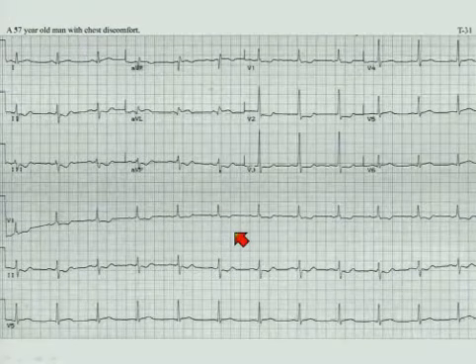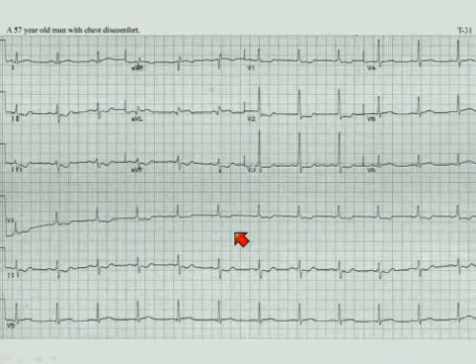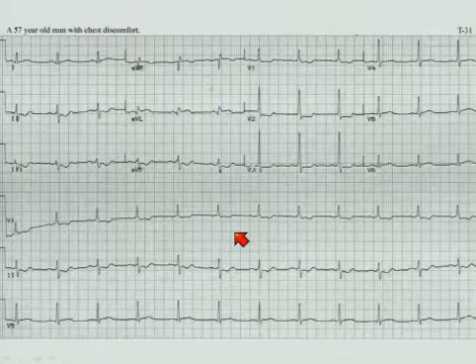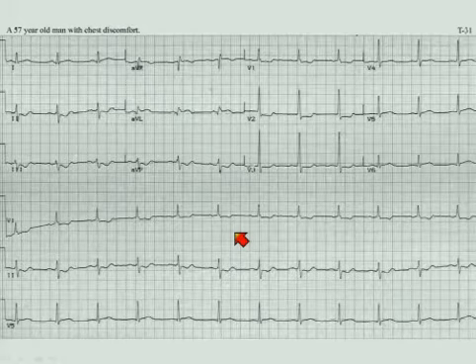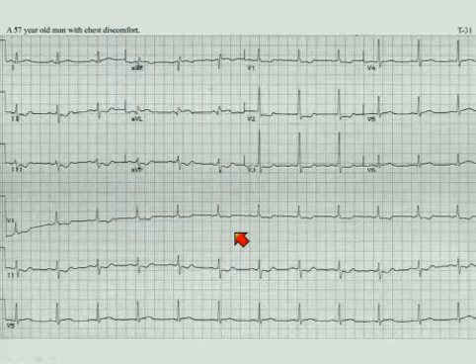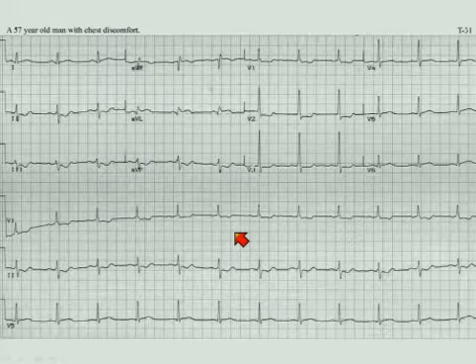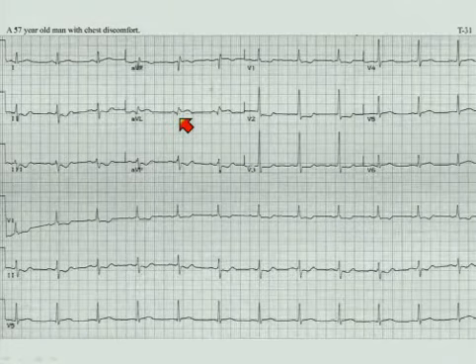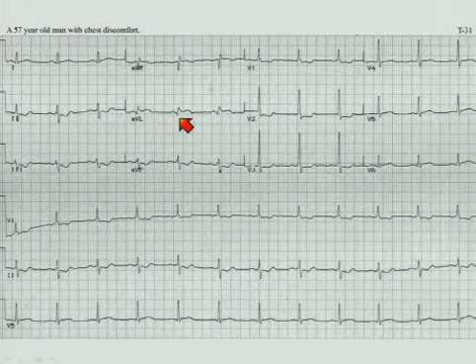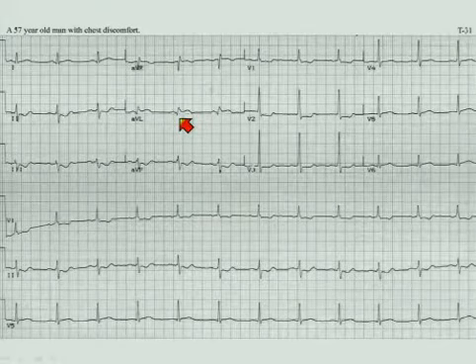Here is a pattern that is one of the more common ones of patients erroneously sent home from the emergency room. I'm sure you all see that this patient, in fact, has a high lateral acute ST elevation MI. Up near the base and in the circumflex distribution, the electrocardiogram does not often show great changes of great magnitude with vessel occlusion.